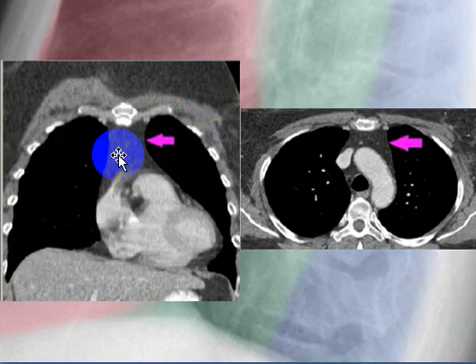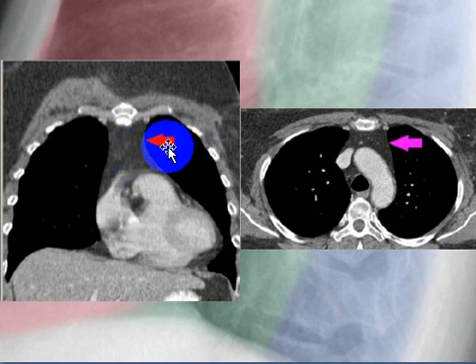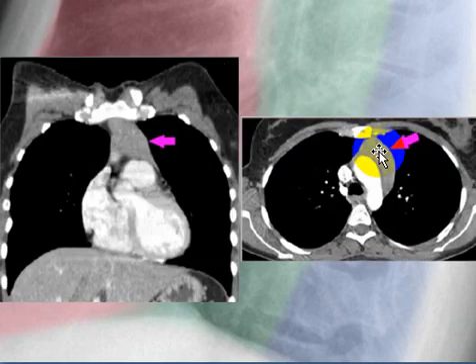Here, the anterior junctional line is widely separated. As we said, there is minimal fat contained between the layers of the anterior junctional line. Here, there is more fat separating the anterior junctional line, containing fat in between the layers of the anterior junctional line.